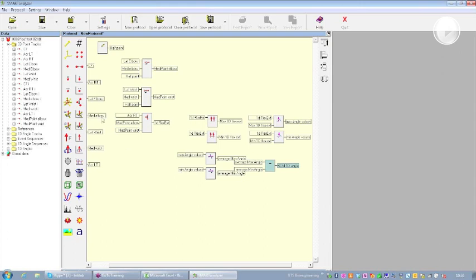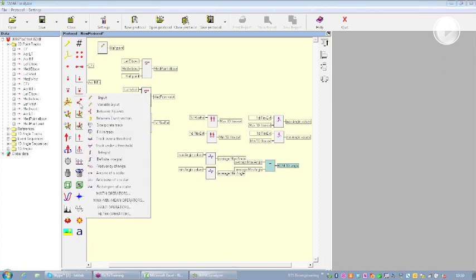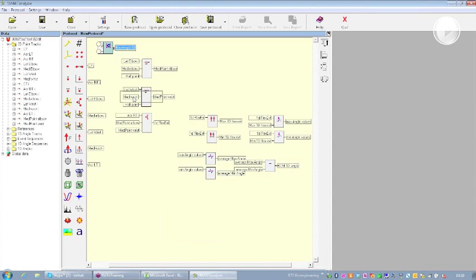So I will select 1D angle, event operators, and event defined cycle. So the time normalization of an object track with respect to one event, okay? So with respect to the same event. So I get my 1D angle, and I want to see what happened between the events in which I'm in a complete extension.